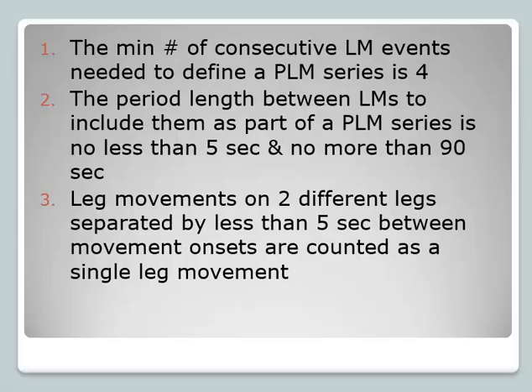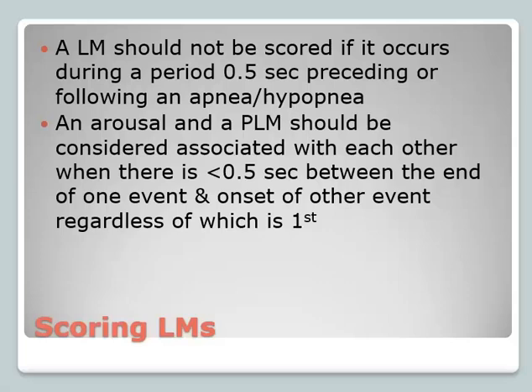You are not marking a leg movement if it occurs in conjunction with a respiratory event. Oftentimes what happens with an apnea or a hypopnea is a person will kick themselves awake. Is it truly a leg kick then? A scorable, diagnosable event? Or is it more a symptom of the respiratory event? That's why you are not marking a leg movement if it occurs preceding or within a respiratory event. It's not a true leg movement. It was a result of the respiratory event.